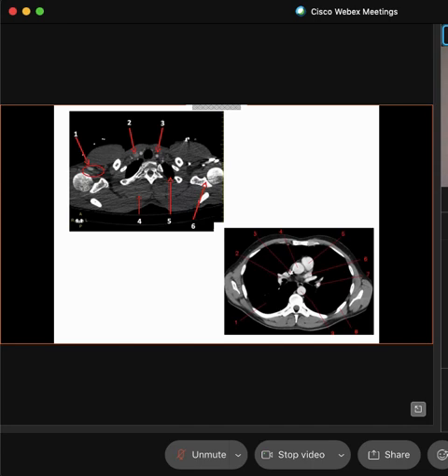The base of the lungs. Base of the lungs? What do you think this is? What would be round, bony material, like this, that makes a joint? Those are the humerus, so that would be the top, the apices of the lung. Perfect. See, this is where the critical thinking comes in.